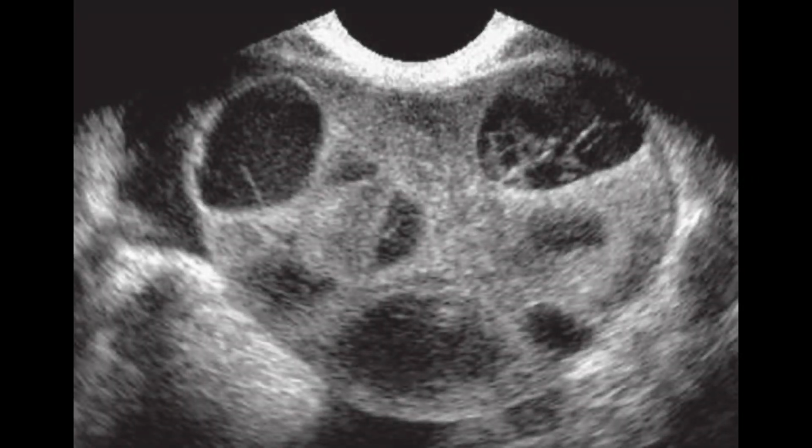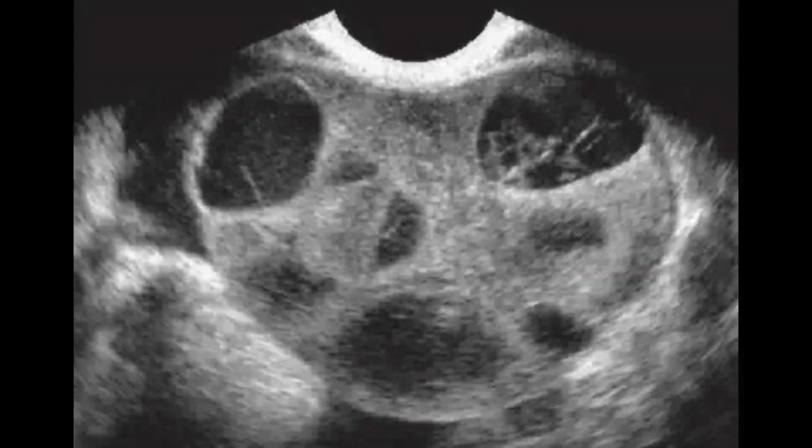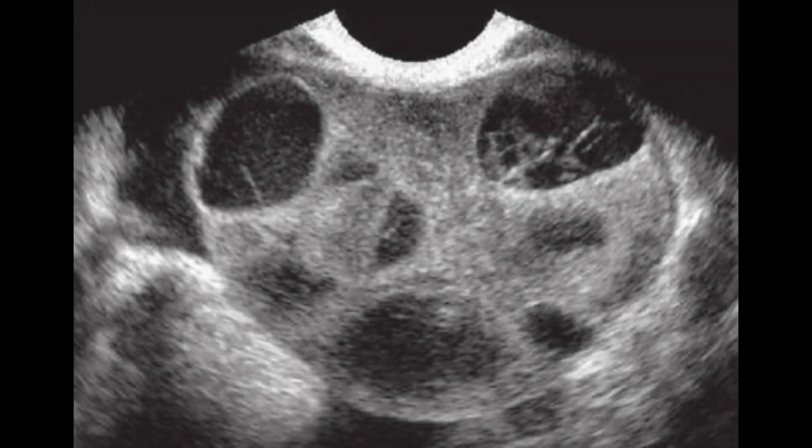Hyperstimulated ovaries are a normal response to elevated circulating levels of HCG. Ovarian stimulation is most common in women undergoing ovulation induction. On ultrasound, the ovaries are enlarged with multiple cysts, some of which may be hemorrhagic. The enlarged ovaries may undergo torsion. They usually regress spontaneously during the pregnancy.